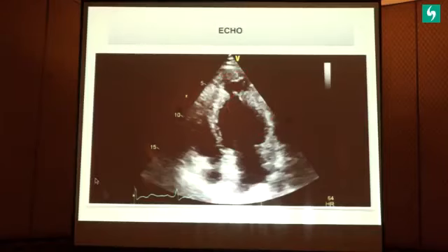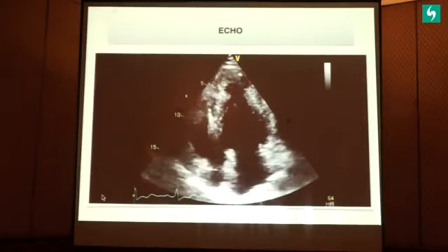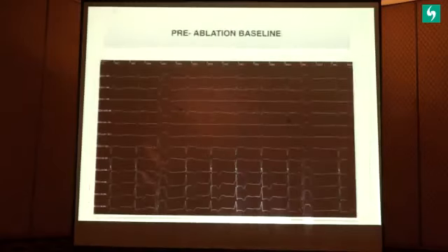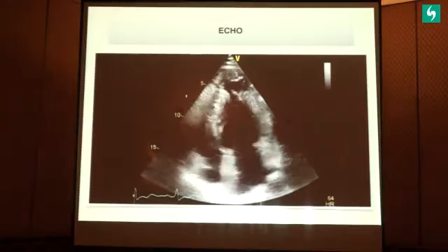What is the disease process? This is hypertrophy. You see this hypertrophy. And then there is a bulge. And then there is something here at the apex. So this is an apical form of hypertrophic cardiomyopathy. I'll run this. You see this aneurysmal apex and a normal looking basal part of the ventricle.